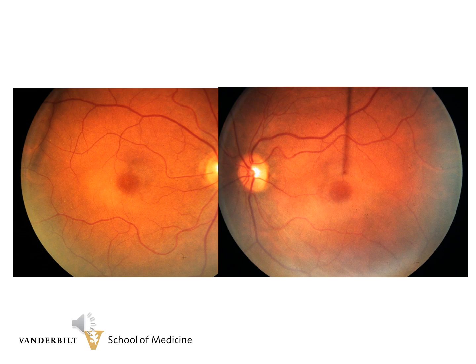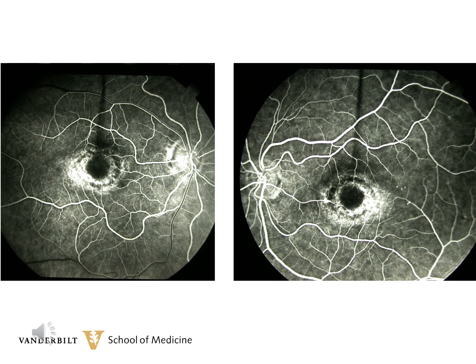Hopefully, you will never see this late-stage toxicity from Plaquenil. This is a 44-year-old female who has taken Plaquenil for about 20 years and has complained only recently about a visual blur. You can see the bullseye hypopigmented rings around each fovea. And here's this patient's fluorescein angiogram, and you can see the very well-developed, sharply demarcated areas of window defects secondary to the loss of pigment epithelium.